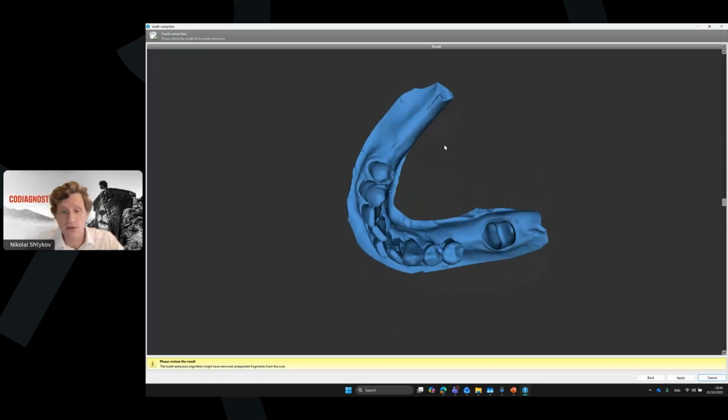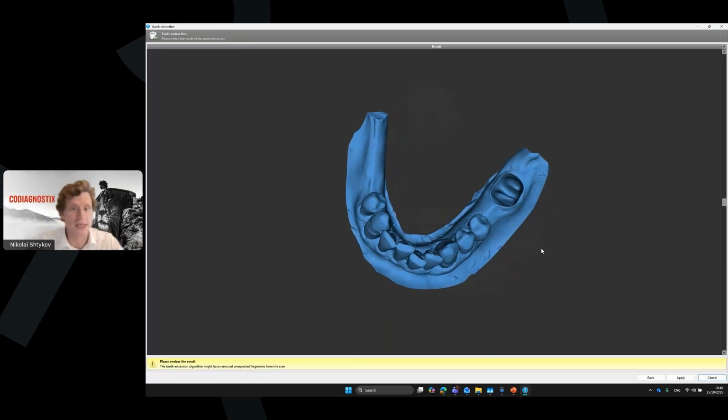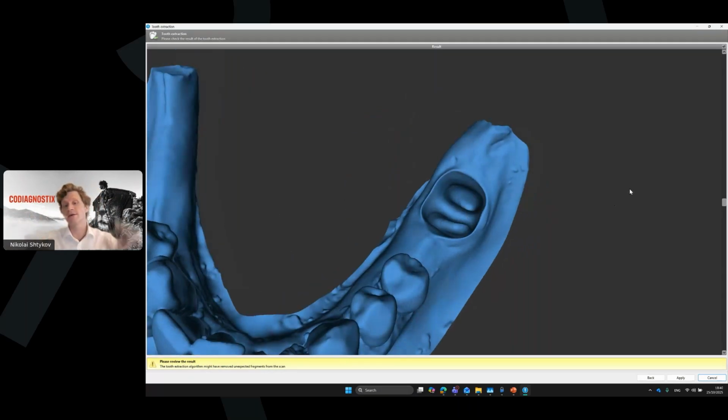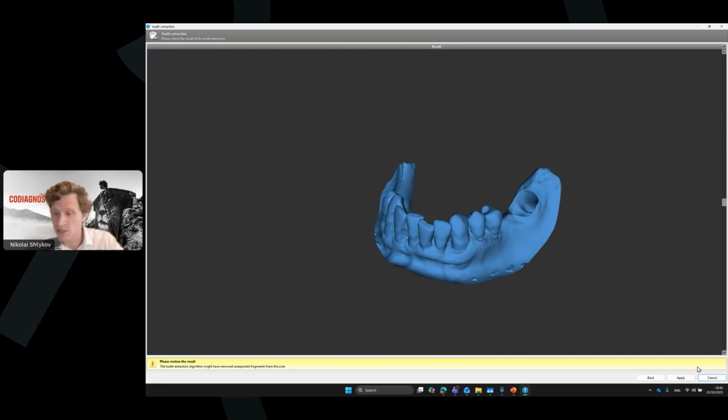You see that it just takes a few seconds. This is not a recording, this is the real-time simulation, and you can see that when we plan our implant, we can really understand where we will have the extracted tooth and where we will have bone. Yeah. But for this case, let's maybe extract in a different way.